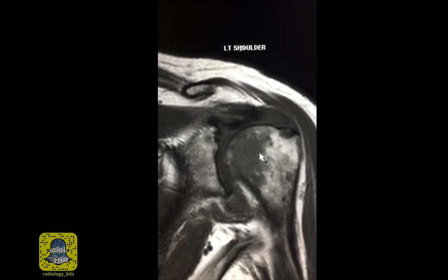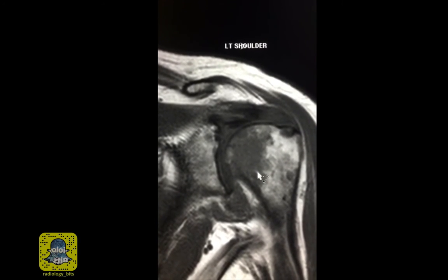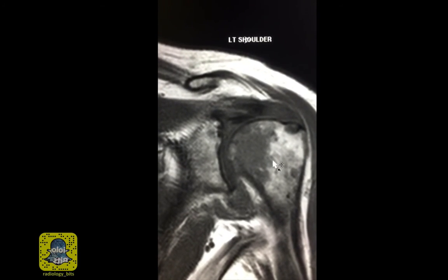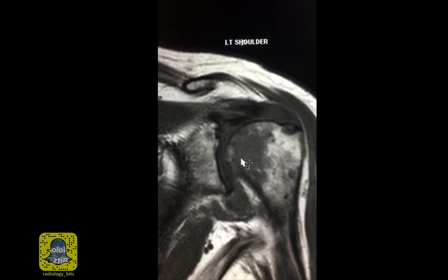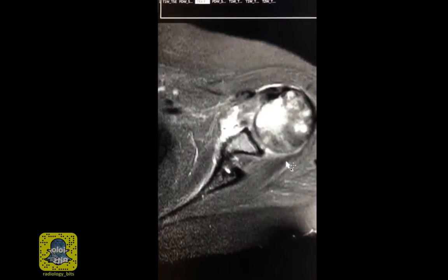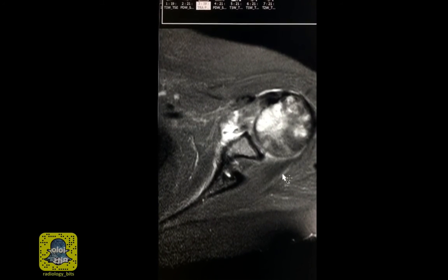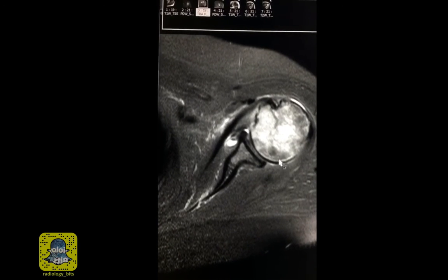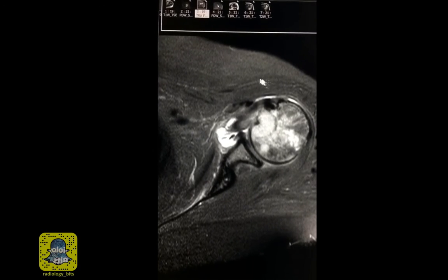When you're looking at cases that are protocoled as rotator cuff abnormality, you rarely think about malignancies. And the fact that you do not give contrast makes this more difficult, because if you gave contrast and you see typical enhancement, you'd really push for a neoplastic process. The other problem with this case is what we know as satisfaction of search. This is a mistake that we try to remind ourselves not to fall into. You see a very obvious abnormality and you forget to look at the remainder of the scan.